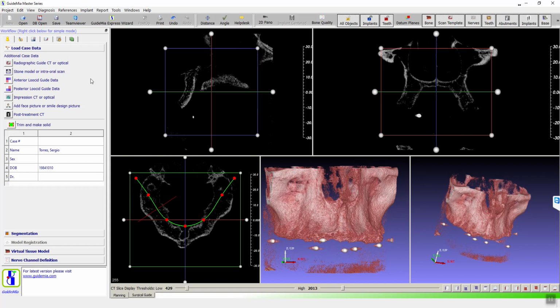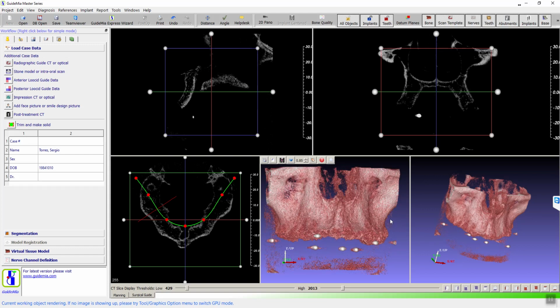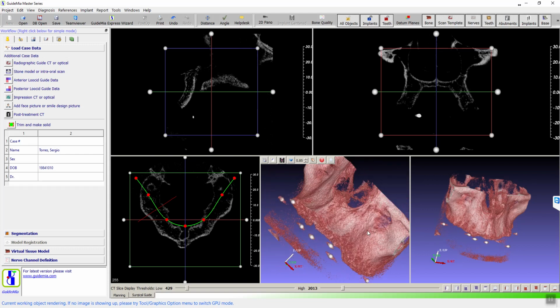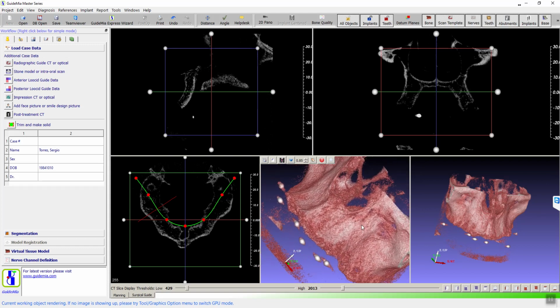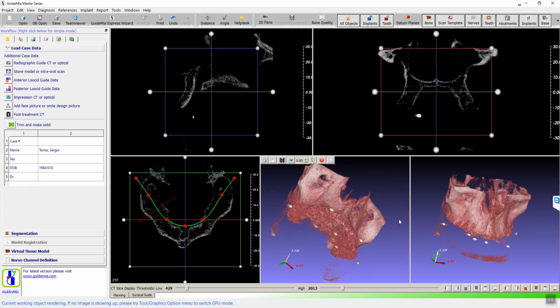That's pretty much the workflow itself. Basic operation of the mouse and keyboard, as we said, we covered last time, but just to repeat a little: left button is to rotate, right button press and move is to zoom in and out.